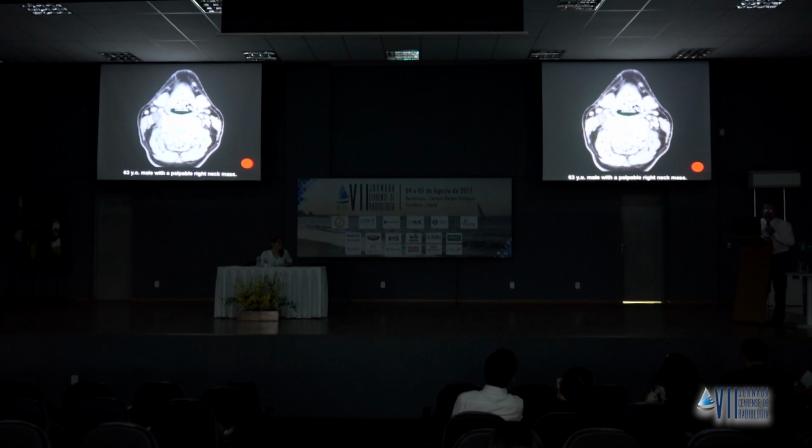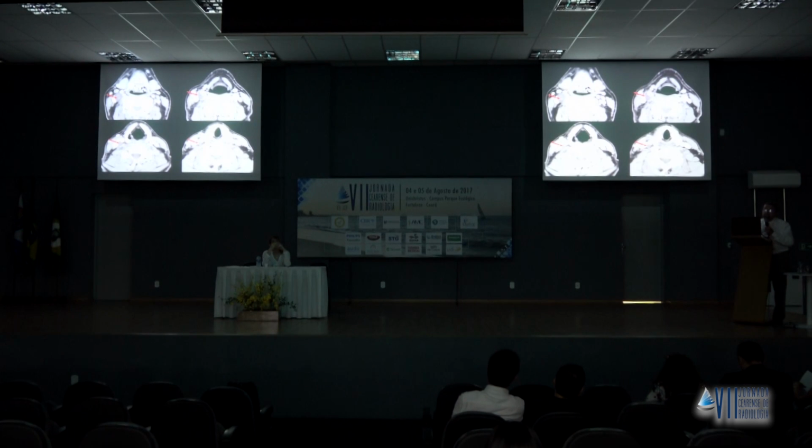The other tumor that is very common in this location would be the neurogenic tumors. Usually it will be a vagal schwannoma or neurofibroma, almost invariably pushing the carotid artery anteriorly because the vagus nerve runs behind. And you see here the internal carotid, the external carotid, the tumor behind it, and the vein pushed back there. This patient had multiple neurofibromas, and in the same vagus nerve, I see at least 2-3 more.